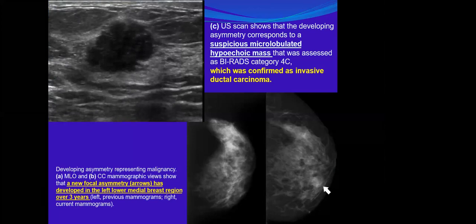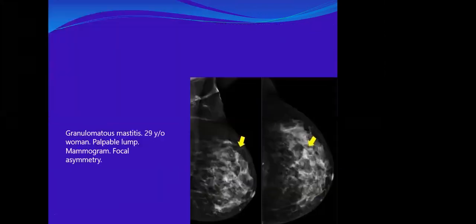This is the ultrasound, microlobulated, you see, microlobulated, and here there are ductal extensions. This is, but not clear. If it is confirmed, if it is larger than this, it will be BI-RADS 5, but it can be BI-RADS 4C, as we mentioned before, microlobulations is BI-RADS 4C. Okay, so this ultrasound is helping us.